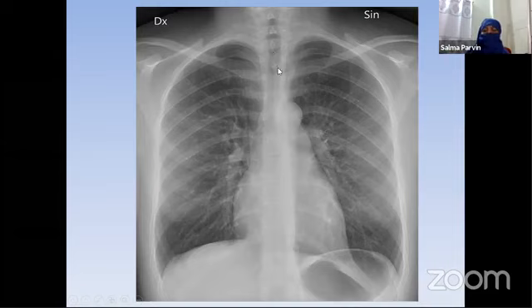In a normal chest X-ray PA film, we measure the distance of the medial ends of the clavicles from a line drawn over the dorsal spines in the upper chest. So we can make a line over here and make sure that both clavicular medial ends are equidistant, at the same distance from the line drawn over the dorsal spine.